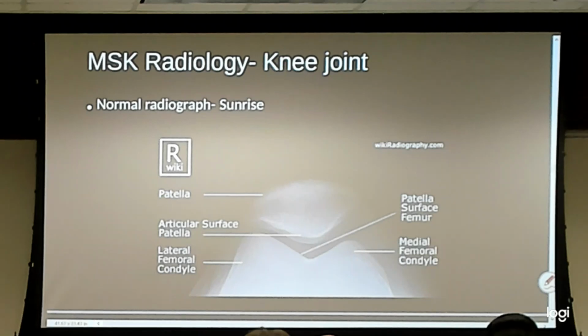It is. Okay. I'm going to say interesting point because you're right. It says that this is lateral and this one's medial, and it makes me upset. Okay. So because you don't have to know it right this instant, I have some better radiographs that we'll talk about when we talk about patellar instability and maltracking.